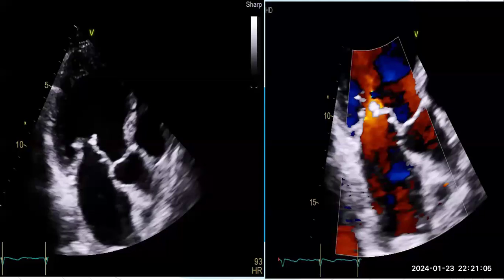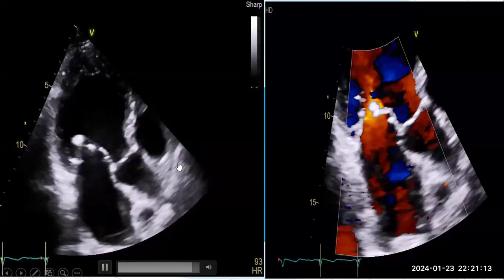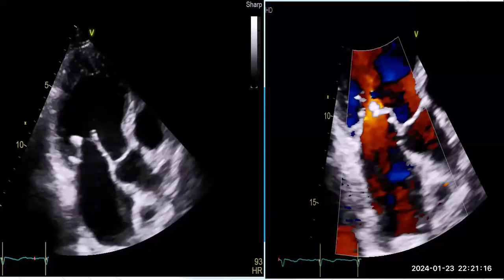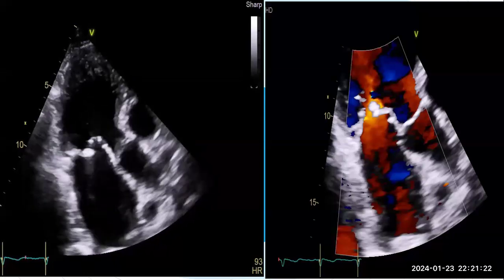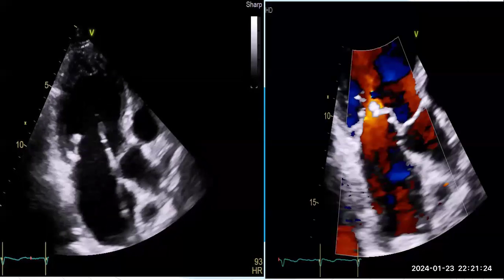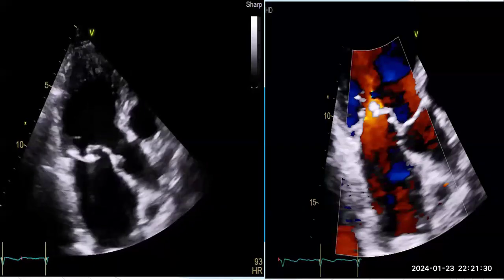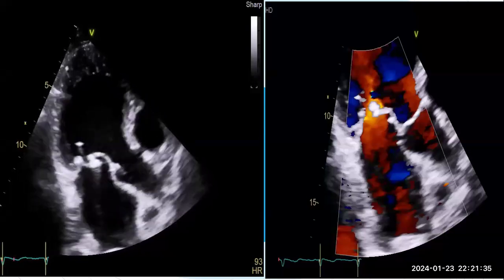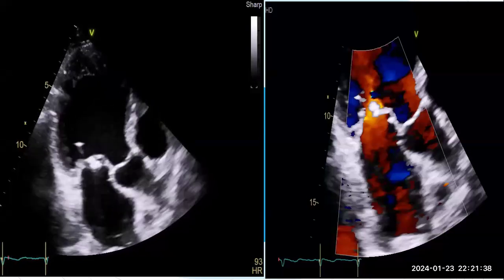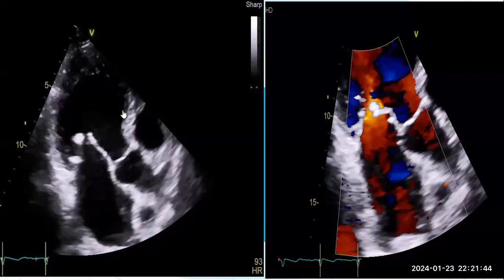There was a discussion about the possibility of this. As I told you, you give him all the differentials of the masses that attach to the tip of the mitral valve, which might be a true vegetation, it might be thrombus, it might be a bout of connective tissue degenerative change, all of this. Okay, so it's like an open discussion. He did not ask you specifically what is the definitive diagnosis. He just asked about the differential. And if he asks you, based on the history, which one is likely the diagnosis, you can answer this is a Libman-Sacks endocarditis. Tamam?